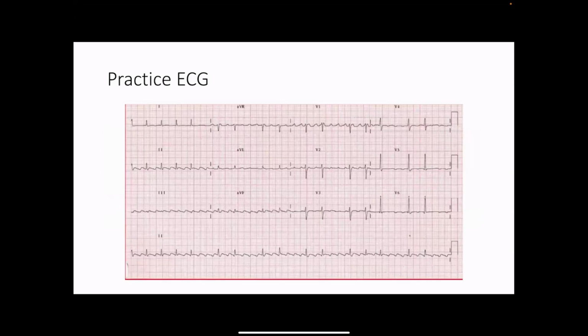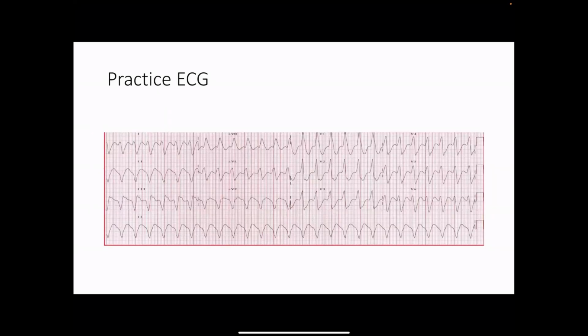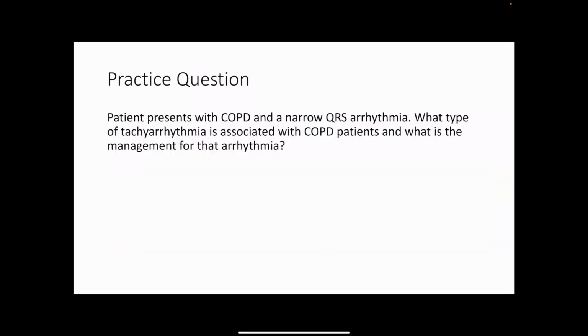What about this one? Atrial flutter. Exactly, sawtooth appearance, atrial flutter. Okay, what about this one? Ventricular tachyarrhythmia. Exactly. It's wide QRS and it's regular. Ventricular tachycardia.